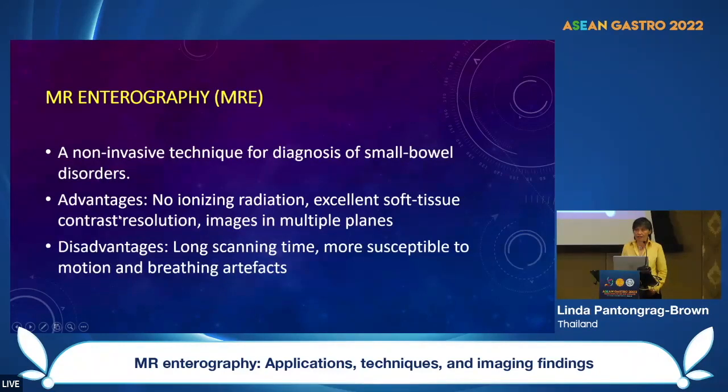What is MR enterography? MR enterography is a non-invasive imaging technique for diagnosis of small bowel disorders. It has some advantages, which include no ionizing radiation, excellent soft tissue contrast resolution, and we can have images in multiple planes.